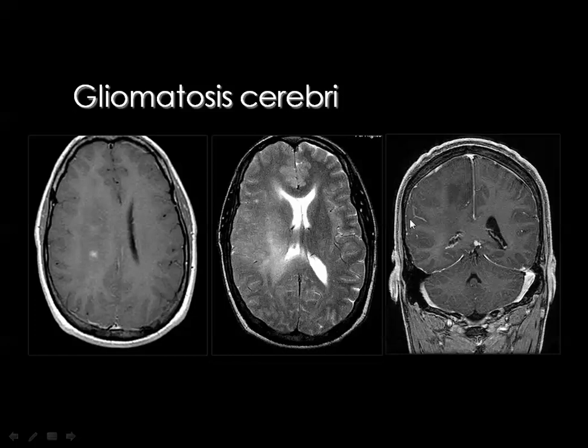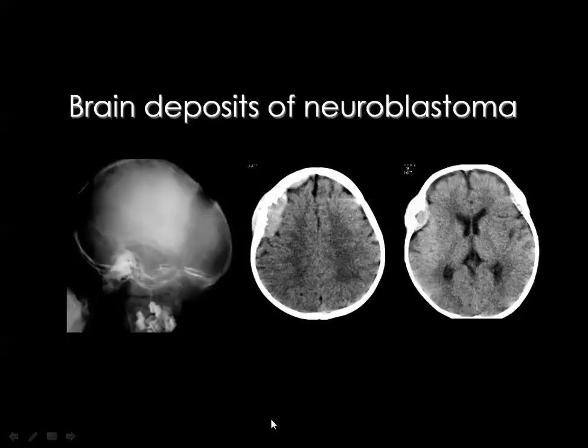Metastases in the pediatric brain are not commonly seen like those metastatic deposits in adults, but in cases of neuroblastoma, for example, which is one of the lesions commonly seen in our practice, the metastatic deposits have certain definitive criteria, being located at the suture line, and they result in marked widening of the suture. And in these areas, you see a mass which is most likely homogeneously enhancing. It has an intracranial component, and many times it also has an extracranial component.